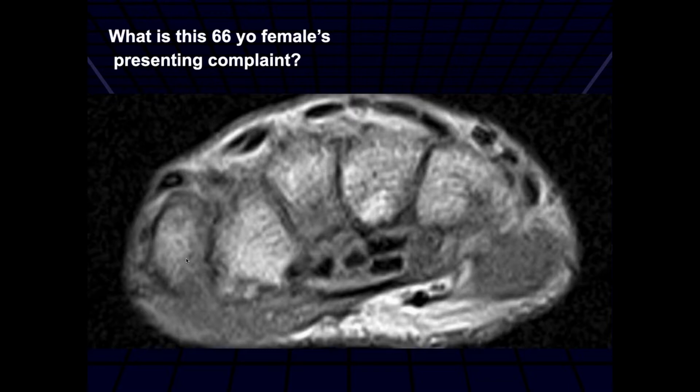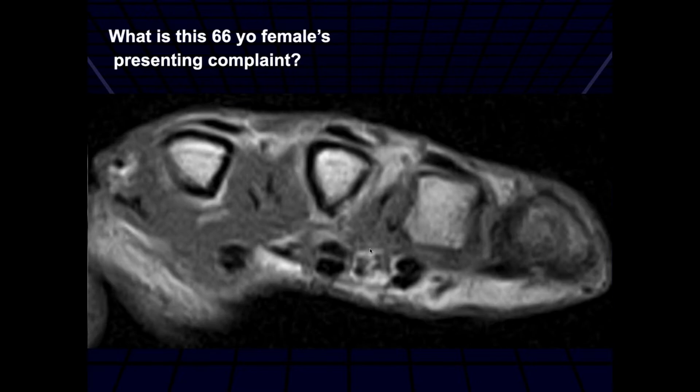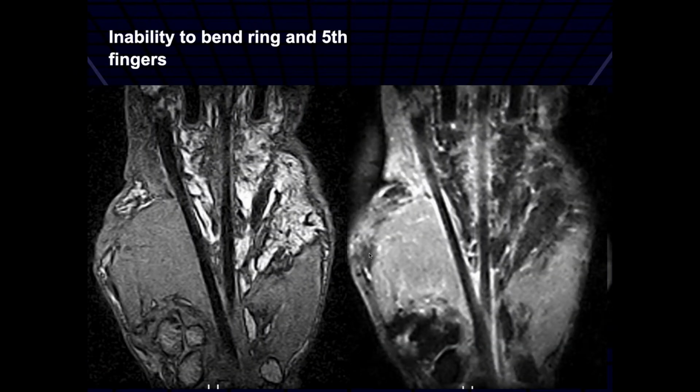So what is this 66-year-old female's presenting complaint? Looking here, it looks like the tendons aren't quite what I'd expect. There seems to be some absence of some tendons there. Distally, I see some normal tendons there, so I'm guessing they're ruptured. Yeah, she can't flex her fingers.